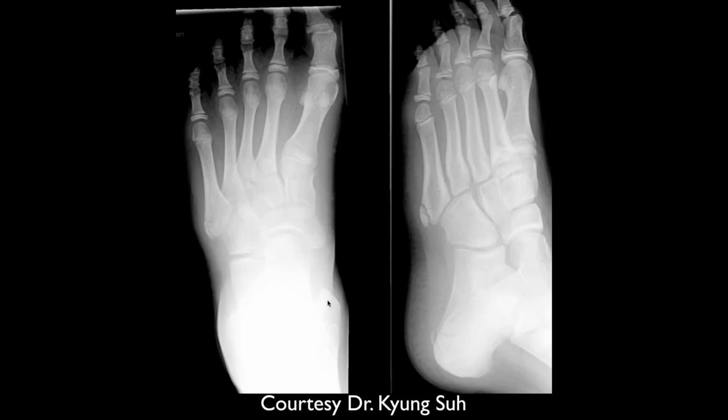And this is the typical oblique orientation of apophysis. Fractures, avulsion fractures, occur in this plane. Apophyses occur longitudinally here. There are three different variations. But you know how I feel about variations.